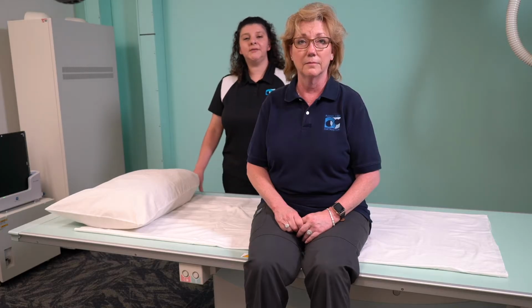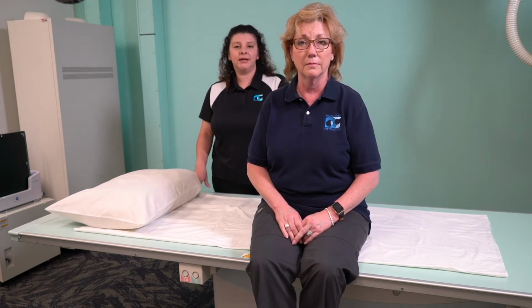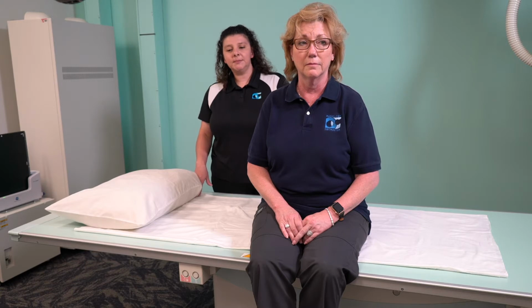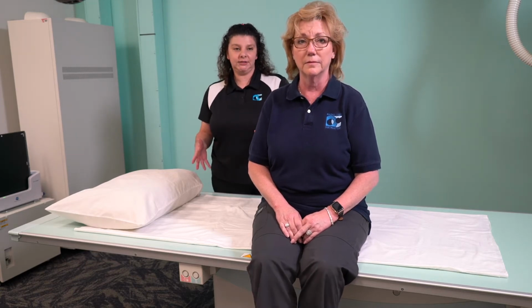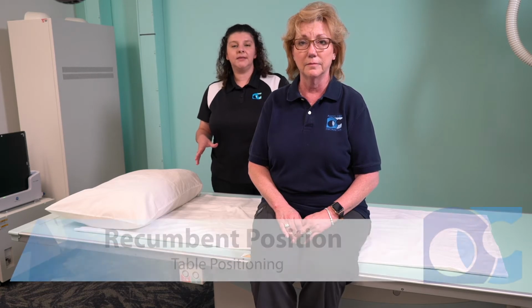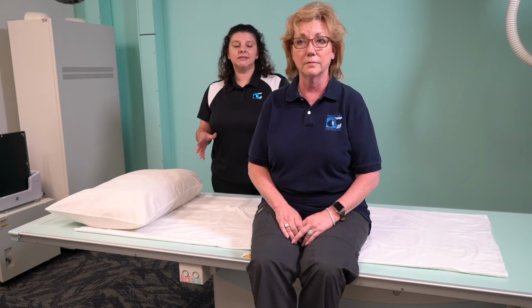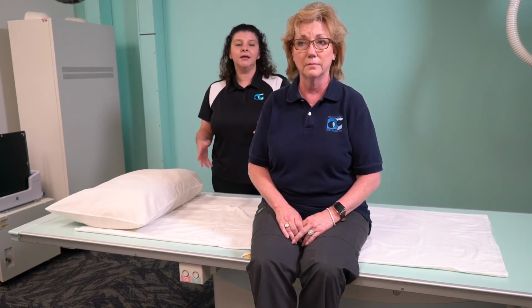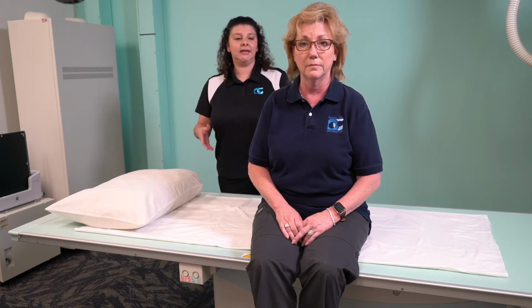Okay, so what we're going to be covering today is some general body positions that you will be doing in radiology. When we talk about general body position, it's just the general position of your patient. We'll start off with the recumbent position. Remember that recumbent just means the patient is laying down in any position. They can be on their side, on their stomach, on their back.